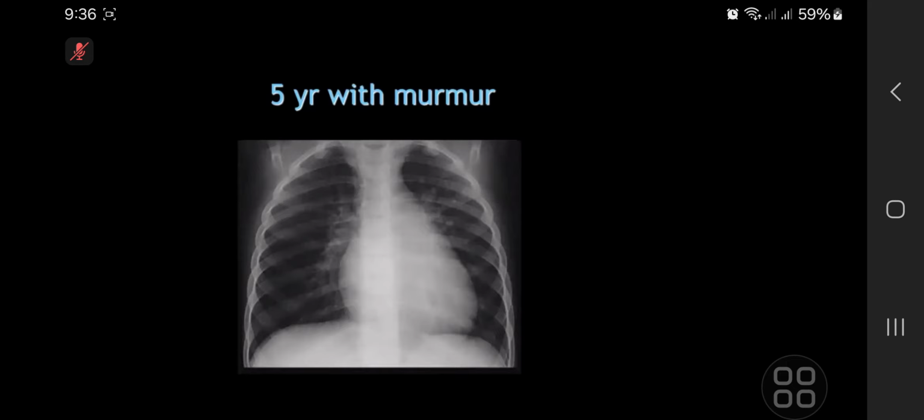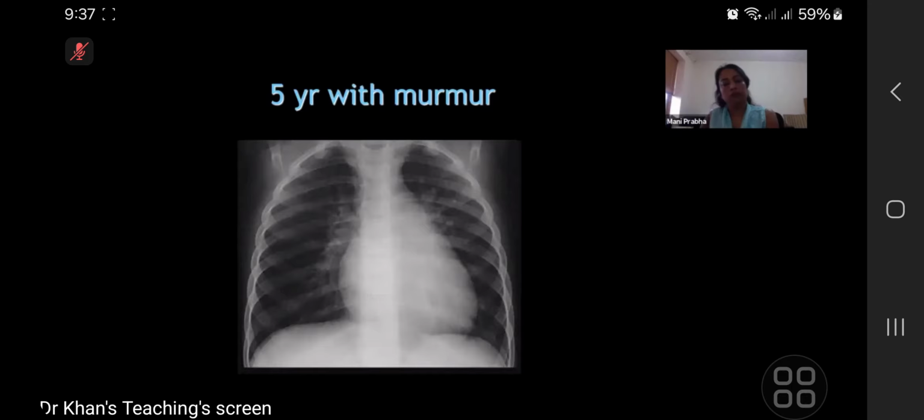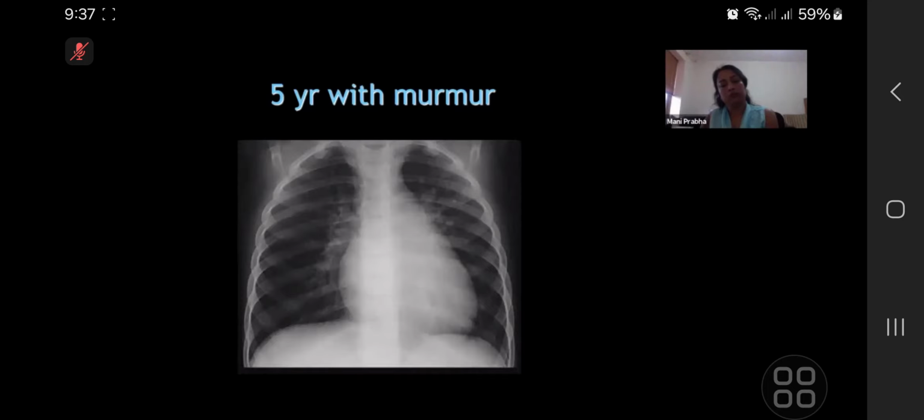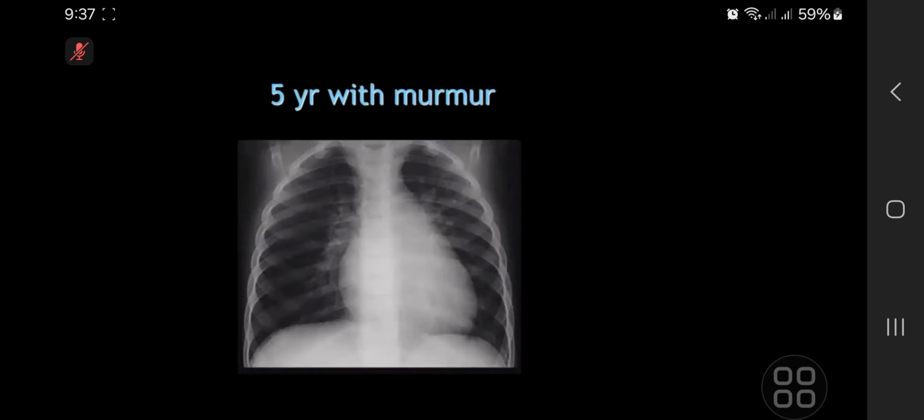There is cardiomegaly, but only mild. The apex is appropriate; it's not upturned or dipping. On the right heart border, there could be subtle right atrial enlargement. It has a slightly more convex contour, I would say. Looking at the spine, ribs, and sternum, I can't see any other abnormalities.